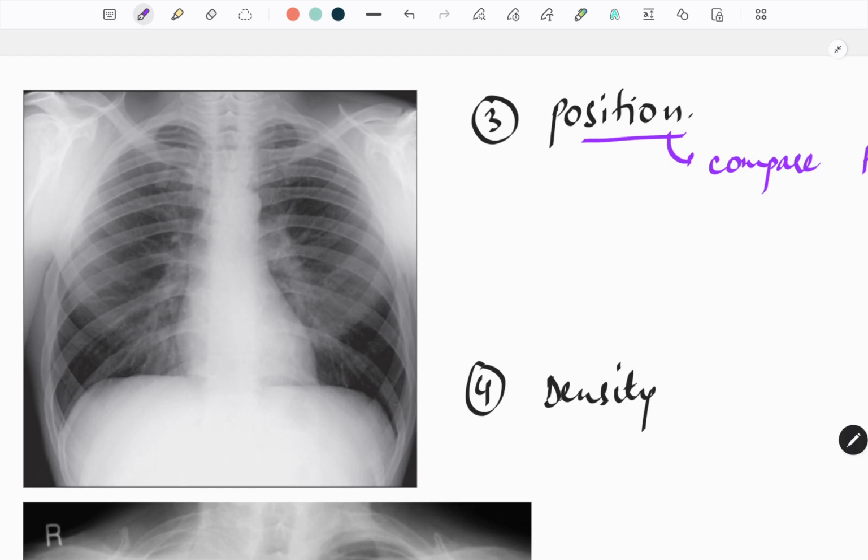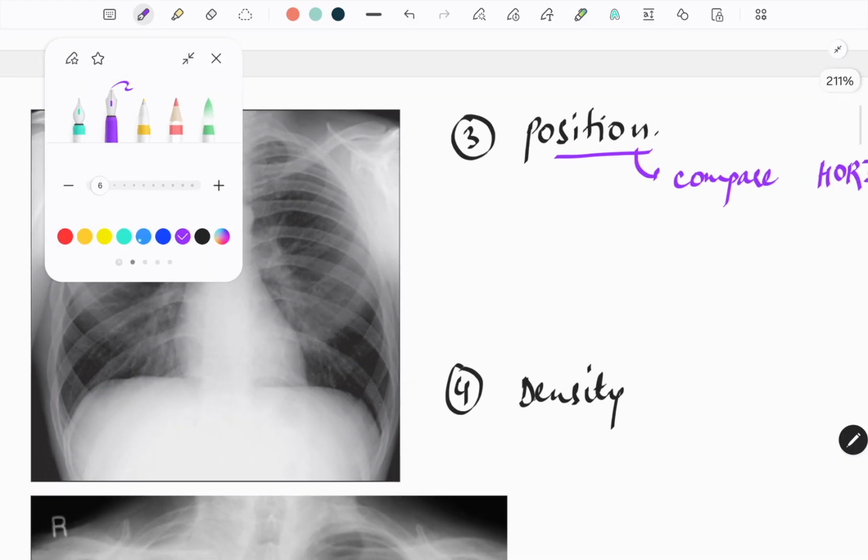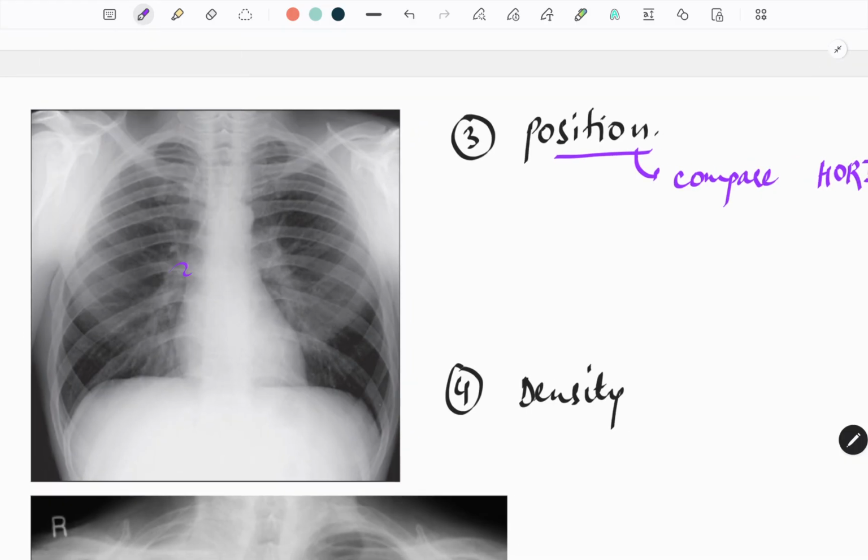This is the lower lobe. This is the lower lobe pulmonary artery here, which is directed inferiorly and medially on the right side. This is the left lower lobe pulmonary artery seen on the left. Now we'll mark the upper lobe vessel.